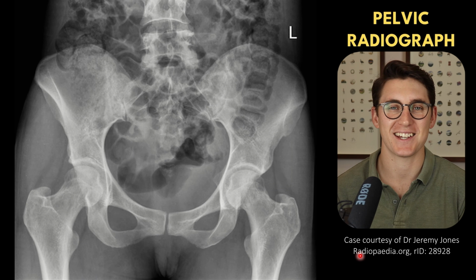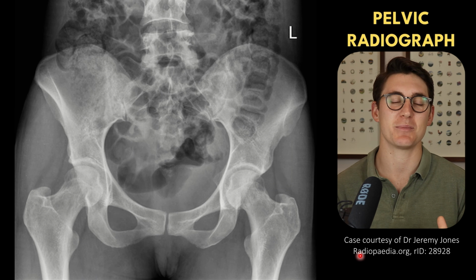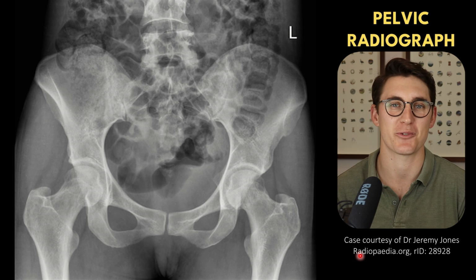Hello and welcome back to another anatomy tutorial. Today we're going to be looking at the anatomy of the pelvis by looking specifically at a pelvic radiograph.